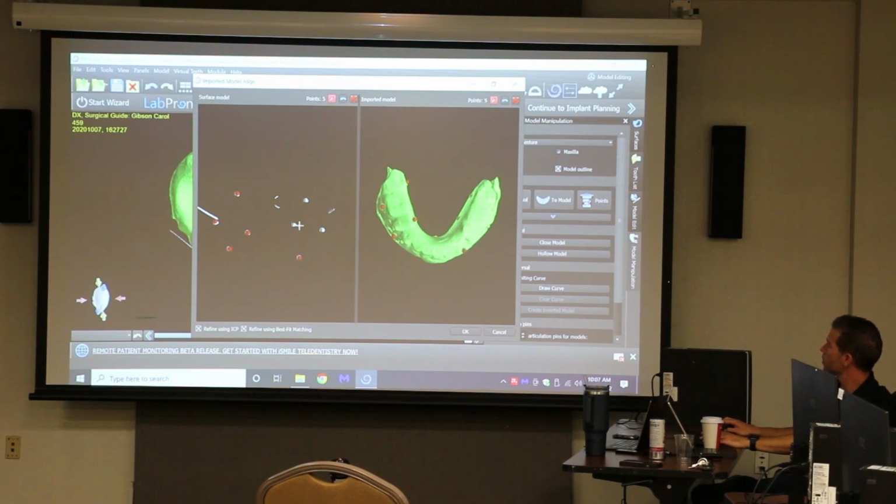I found that this was a little bit easier to look at it from one view rather than trying to roll around and hit it all. So after this section, let's make sure everyone's in the same area. Okay. We're lagging behind a little bit. So I was saying that I was going to go through a fast one and then redo it and kind of walk it through. Does that make sense?